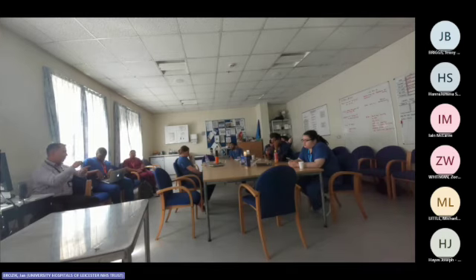That's the thing. There's an important thing, and I accept in intensive care it's a bit different. You're trying to save someone's life, so I'm not that concerned about the amount of radiation. But doing 3 phases means triple the dose of standard scans. So abdomen and pelvis we normally do in PV phase only, and it should answer all the questions: malignancy, abscess, bowel obstruction, perforation, portal vein thrombosis, for example.